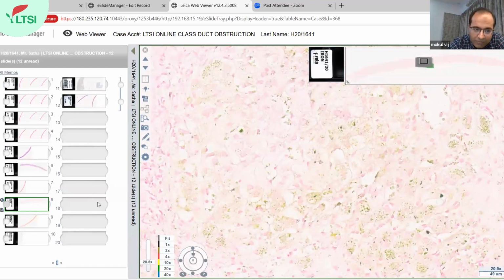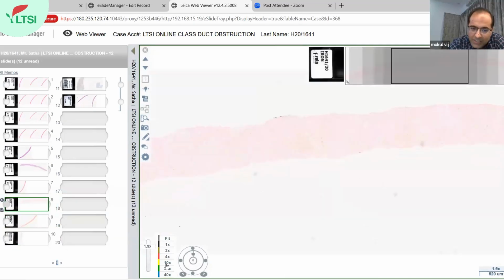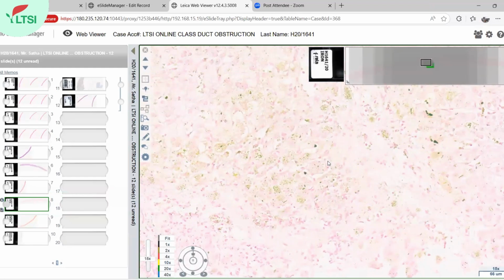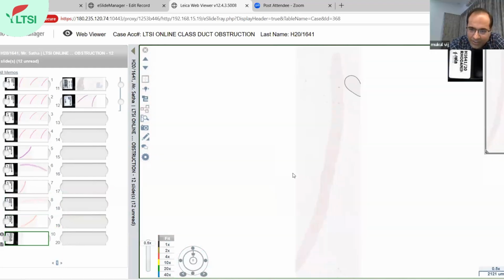So this all confirms the bile in this biopsy. So iron stain is called Perls stain. Yes, Perls stain for the Prussian blue iron color. But if iron is not there, it confirms the bile, Prof. Chronic cholestasis, we are looking for copper. Copper. So that is copper.